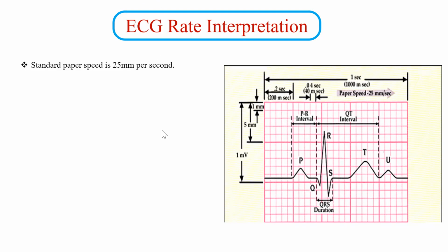All right. Now, if we look here, during 1 second, we eject 25 small squares. So 25 small squares per 1 second is actually 0.04 seconds per small square. So it is 1 second divided by 25 small squares that will be ejected during this time. And so each small square needs 0.04 seconds to be ejected.